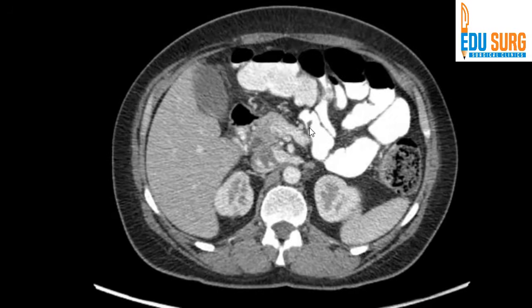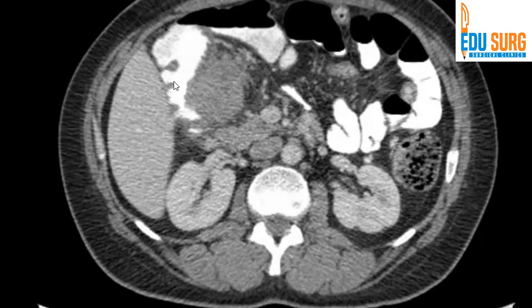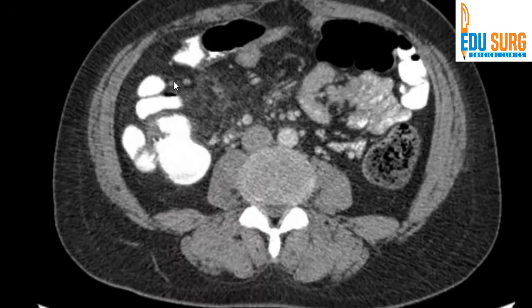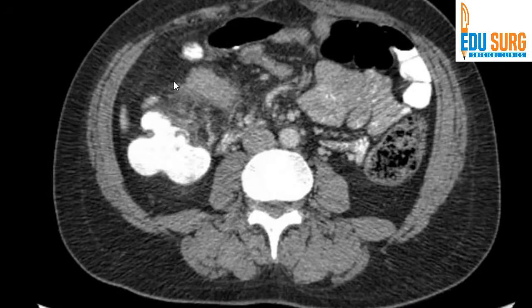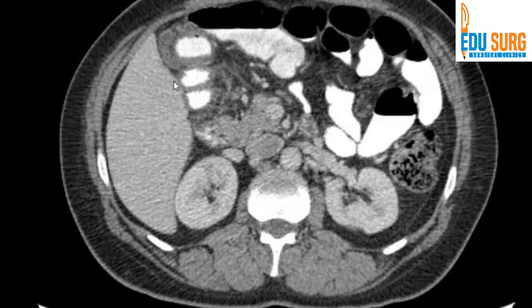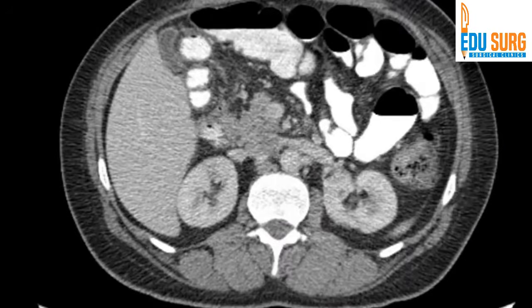We don't see much of metastasis in this area, but a tumor of this size, we will always do a diagnostic laparoscopy before going ahead. You have to look clinically as well. If the patient has partially obstructive symptoms, then neoadjuvant is not going to benefit. You don't have time for neoadjuvant therapy in those kind of cases. So in those cases, you will operate first and then plan the patient for chemotherapy.